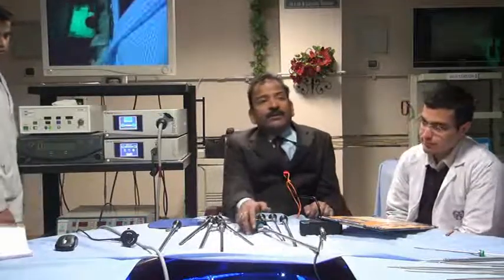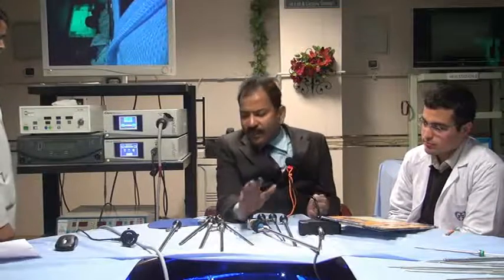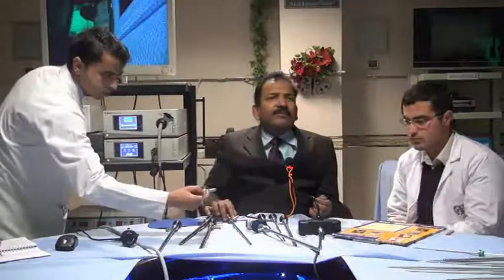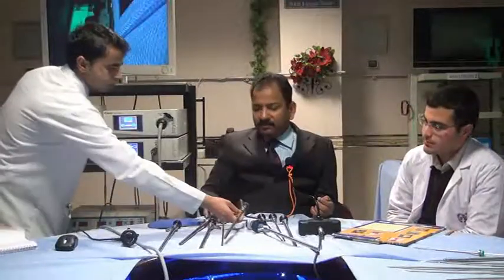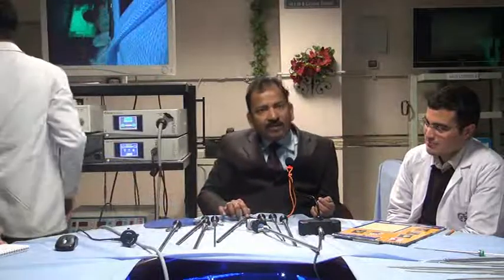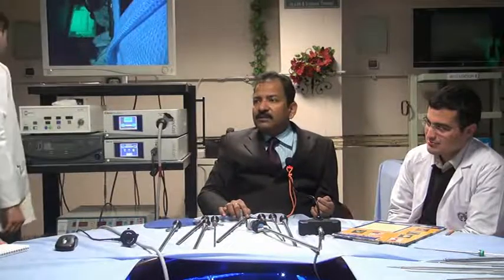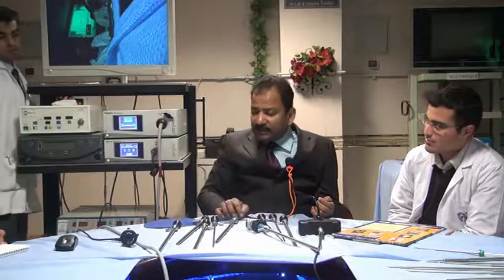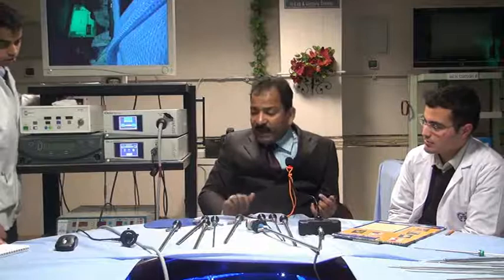Now, the third property of a telescope is the number of rod lenses. The quality of the telescope matters a lot. Every company makes many types of telescopes. Some have 8 rod lenses, some have 12. Some Japanese and Chinese companies have very bad resolution.